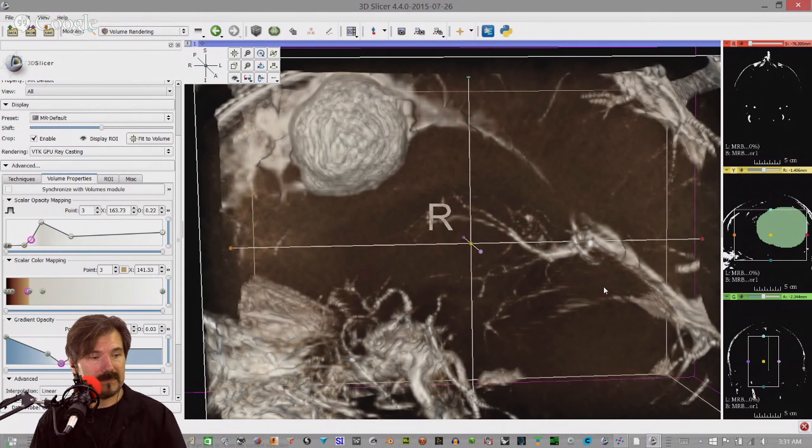Yeah, and Mike, something else to add that I think you pretty much said is the fact that tumors themselves are mostly vascular tissue. So maybe what this is highlighting, what you're doing right now, is just the high vascularity of this tumor, as most tumors are. I know we're working in the brain right now, but there's a lot around the body that could be played around with regarding the vasculature of tumors, such as in liver tumors. And they're obviously doing that.